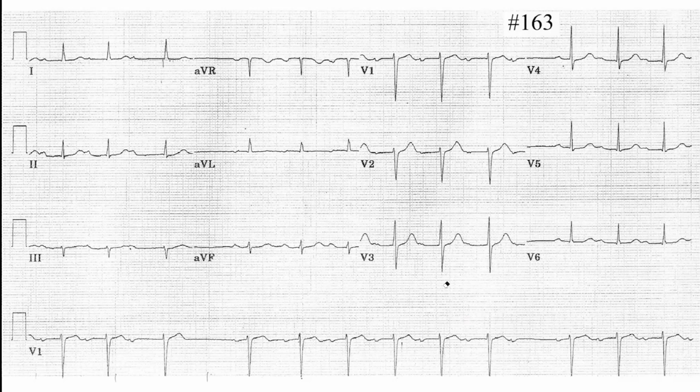Pathological Q waves? The width of the QRS is narrow. There is no pathological Q wave. Okay, so that's it. However, I don't like this area. This one. Now let's see, is it hypertrophy? No, there is no hypertrophy here.